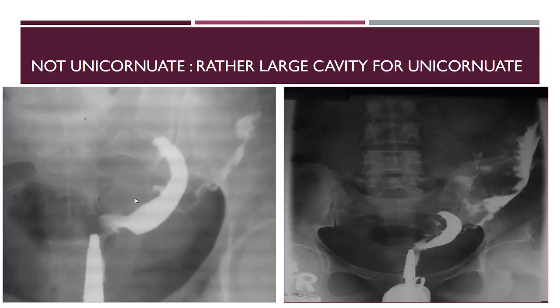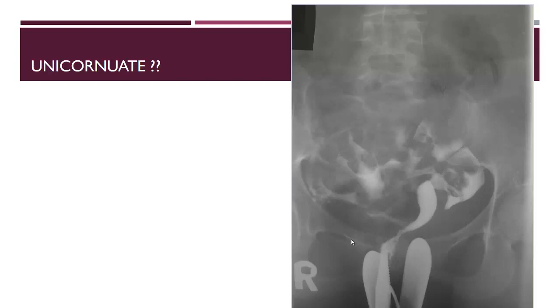When you see that problem, there is something pushing here, which causes intravasation in this part. There is something here causing extrinsic pressure on the uterus and obliterating one of the tubes. Another case, is this unicornuate? Could be, but I couldn't say. I couldn't see both tubes, just I see the spill, and this is a faulty technique. You must take an early film in order to see the early filling of the fallopian tubes. But again, it is displaced and pushed to one side of the pelvis.